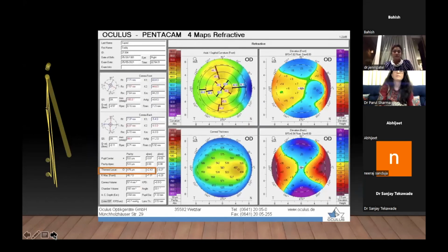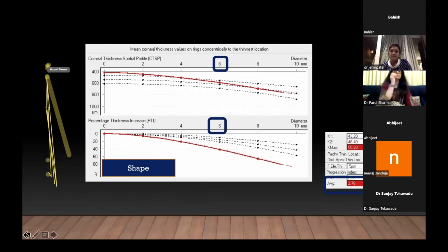Madam, one question. The three lines, the central one we would take as the base, and the upper is the upper limit and the lower is the lower limit. Is it something like that? So it is basically 2 standard deviations on either side.